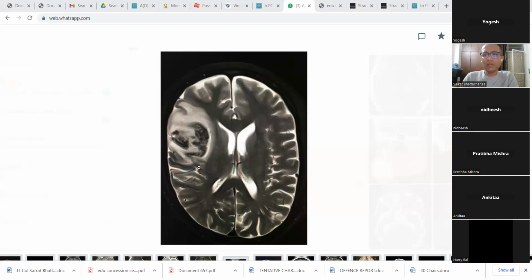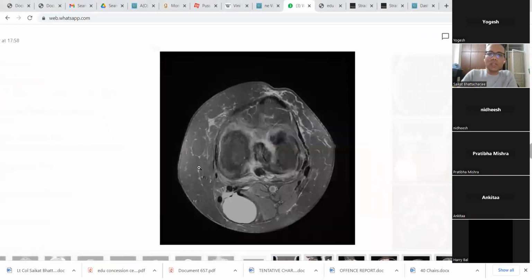When you are going through these images on the screen, there should be thoughts crossing your head. Each one of these images, when you take a single look at any of them, must trigger a differential.